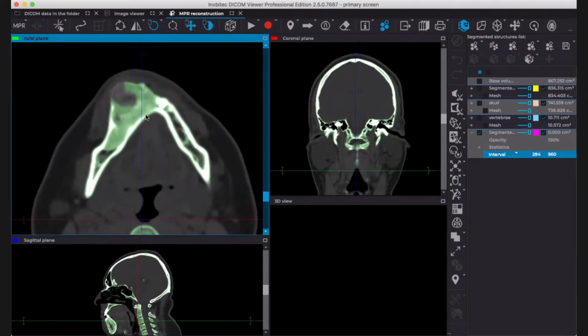So now what we are going to do is we are going to work with another tool. I'll just put it a little lower because I want this part of the model to be included. Okay, so now I have most of it included, and we can work with that later anyways. So now we are going to use this other tool, which is region growing, okay?